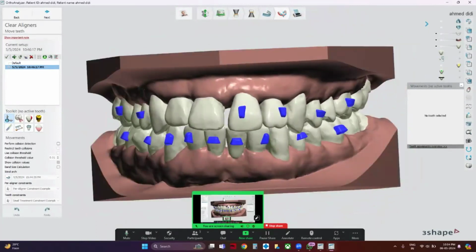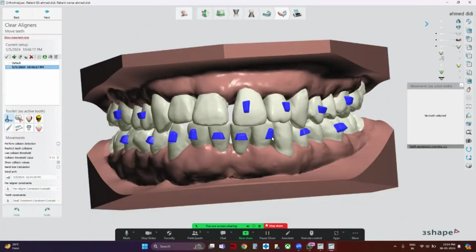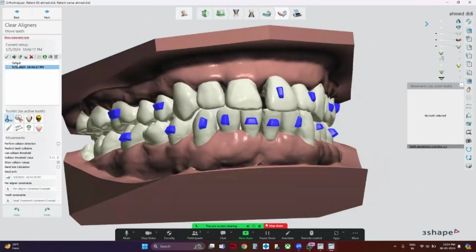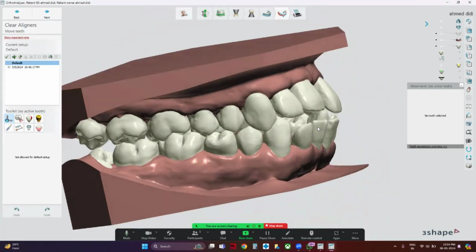No, I'm talking about yourself, because you also should be getting the real colors, since you've scanned it with 3shape. Okay, it doesn't matter. Let's look at the case. Let's go to the pre. You hit the default over here and you can evaluate the patient's pre situation.